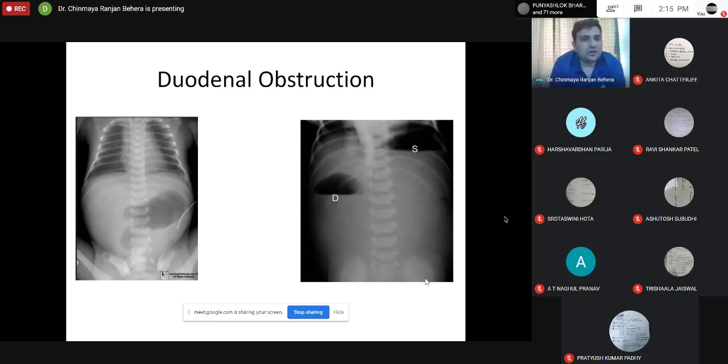So now coming to another X-ray. This is an X-ray. You can see the bony fusion has not yet occurred. So this is an X-ray of a child or an infant. Okay. So in an X-ray of a child or an infant, what you see is the chest. You can see the abdomen, the whole abdomen. Also, what is abnormal here is in the abdomen. Normally what you see is only the gastric shadow.